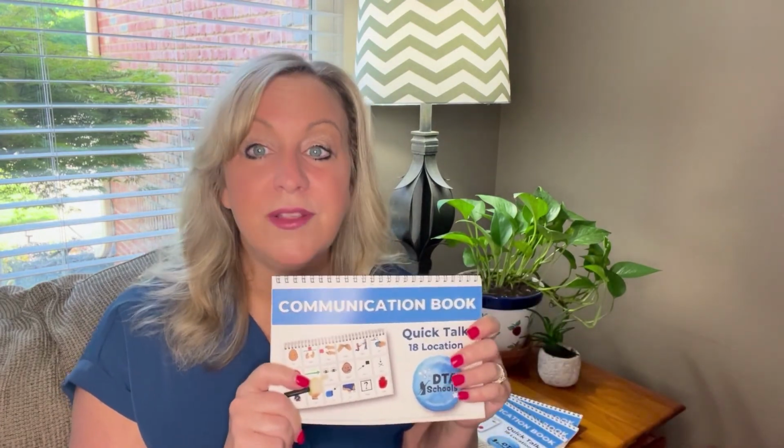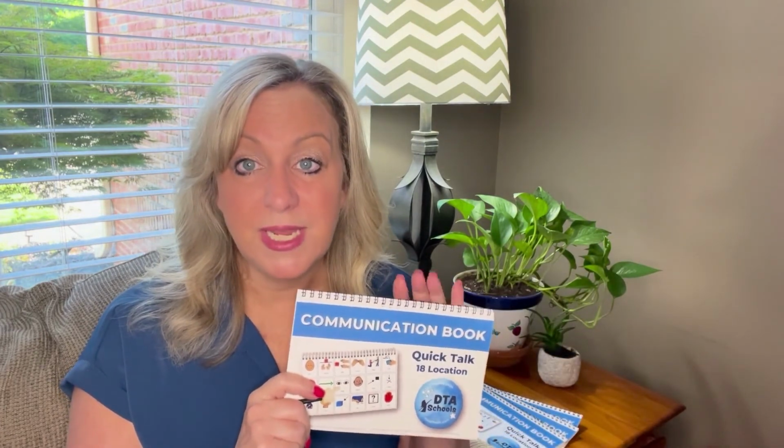So that's about it. This is your quick start. This is your baby steps into using aided language input, modeling communication for your students. Give it a try. It's going to be messy. You're not going to like it, I'm going to tell you, at first, but that's okay. It's okay for our students to actually see us learn too. They need to hear us talk it out when it's challenging. That's okay. That's all part of learning. So don't worry about making mistakes. Laugh it off, talk about it to your student, and keep on talking.